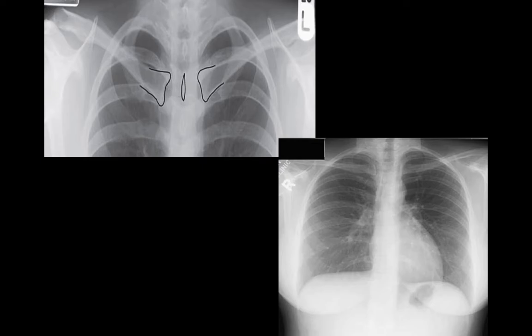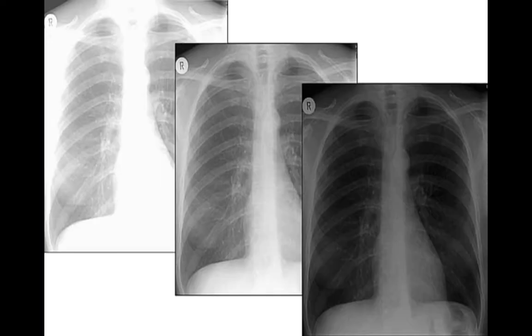This is important because sometimes the trachea appears to be shifted to the right or to the left, and we can make a misdiagnosis about volume loss. This is also very important, especially for aged patients, because of the exposure. This is also not the duty of the radiologist or the physician, but he has to know so he shouldn't make any misdiagnosis. He should know whether the X-ray is overexposed by radiation, or the contrast settings were low, I should say.